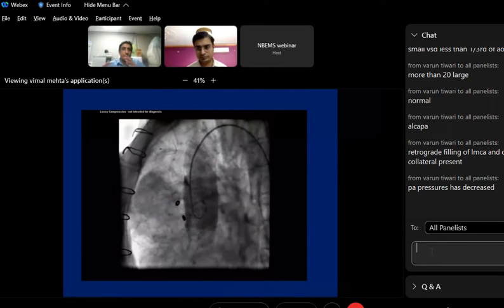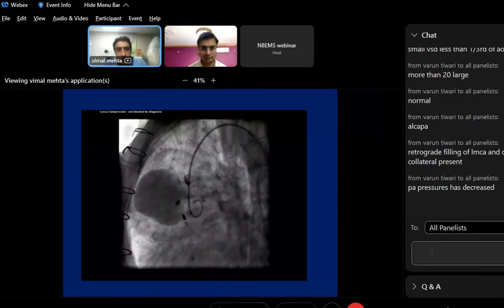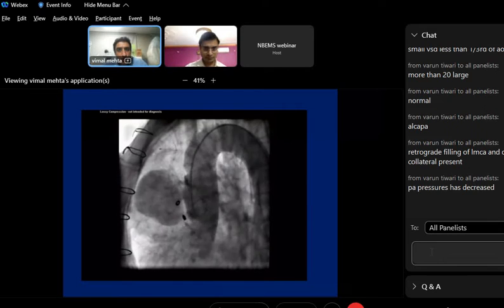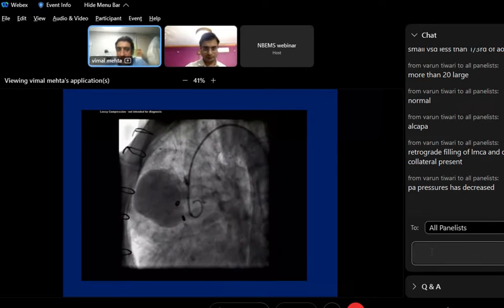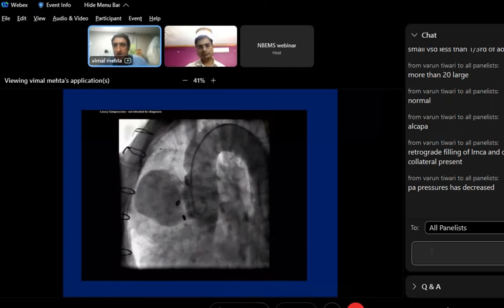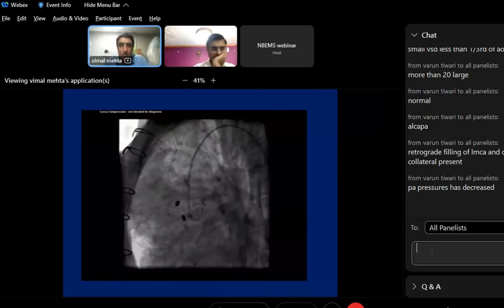You do not have to focus on what is very obvious. You have to focus at the adjoining findings also. Overall, you have to see the picture as a whole. Okay, aortic root angio, very good. Aortic pseudoaneurysm, okay, very good. So what could have caused it?